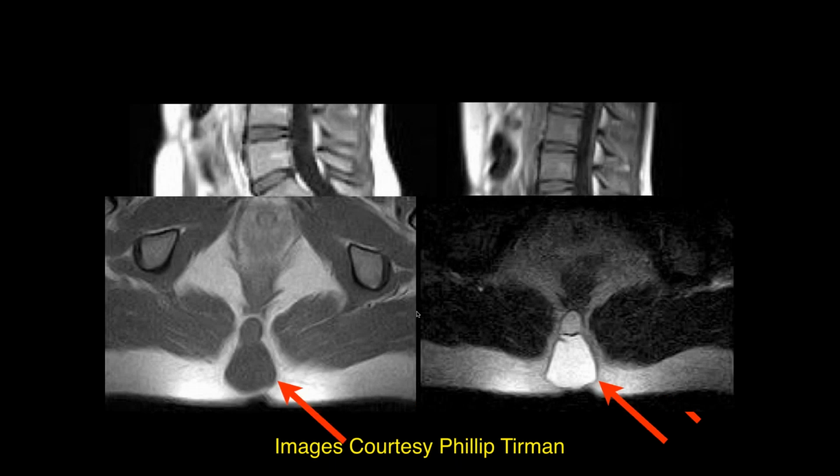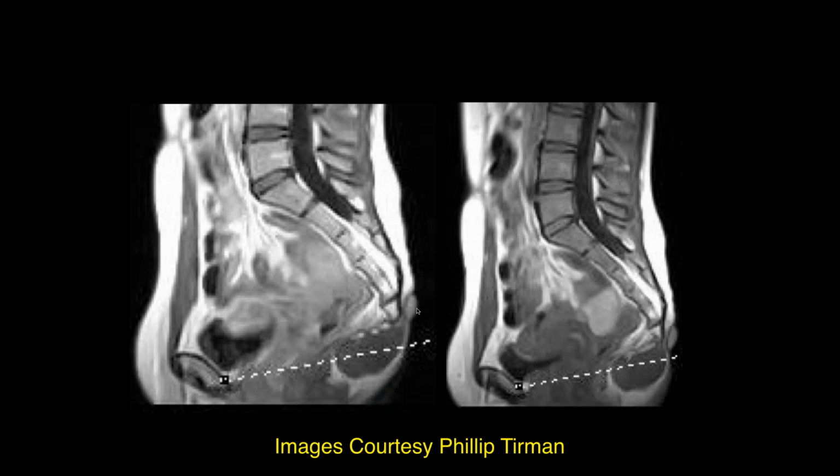So yeah, this is also cystic. I guess this could be a Tarlov cyst. Well, this is really out. Yeah, you see, here's the kind of the spine and so forth. This is more in the subcutaneous tissue, but I would certainly be concerned that that's the case.